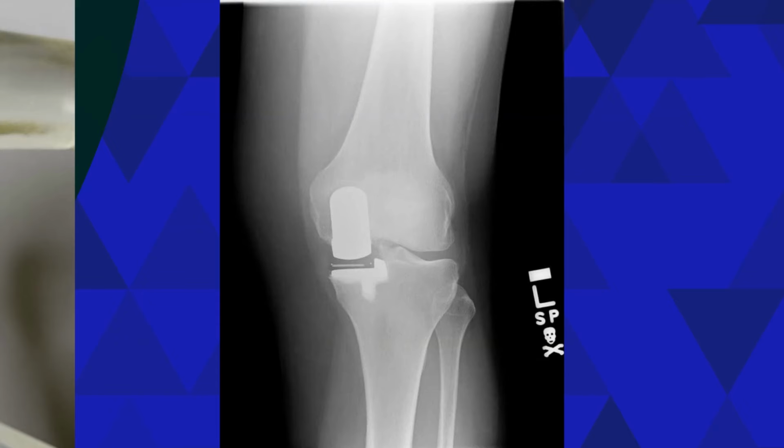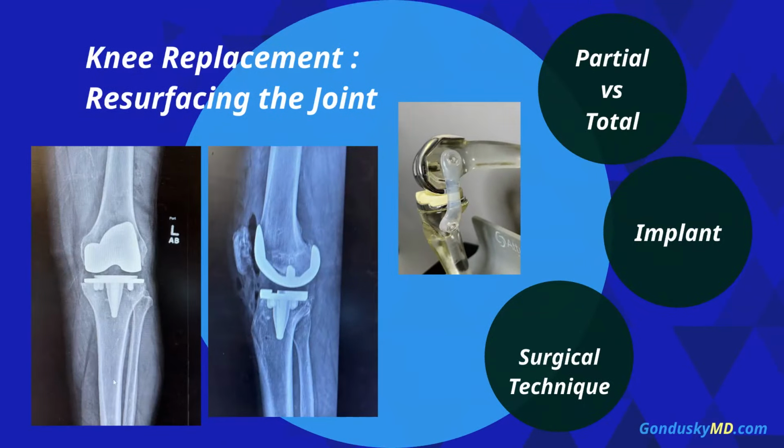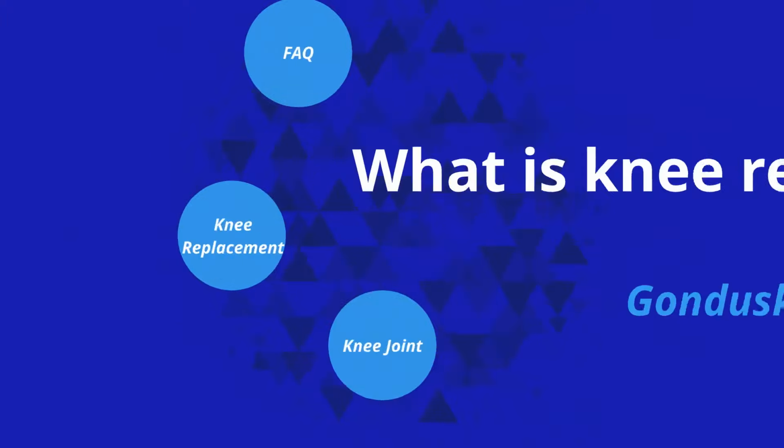And there's really three parts to the knee, so this helps kind of show you the three parts of the knee. You have that inside aspect of the knee, which is replaced with the partial knee on this patient, the outside aspect of the knee, which is untouched, and then the front, which you can't see on this x-ray, is the kneecap joint. So in a partial knee replacement of the inside aspect, only one of the three parts is replaced. On a total knee replacement, all three parts are replaced. And that's the difference between a partial and total knee from an x-ray standpoint.